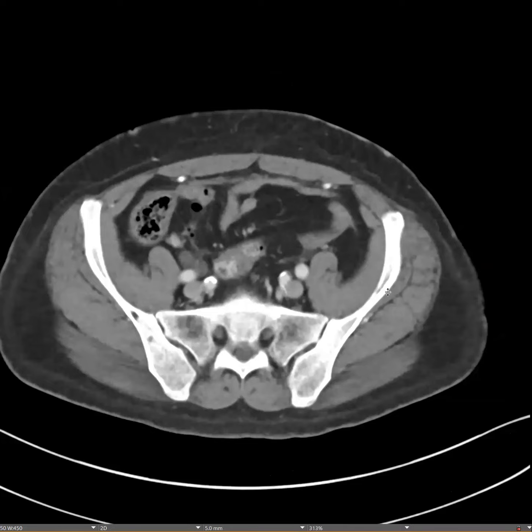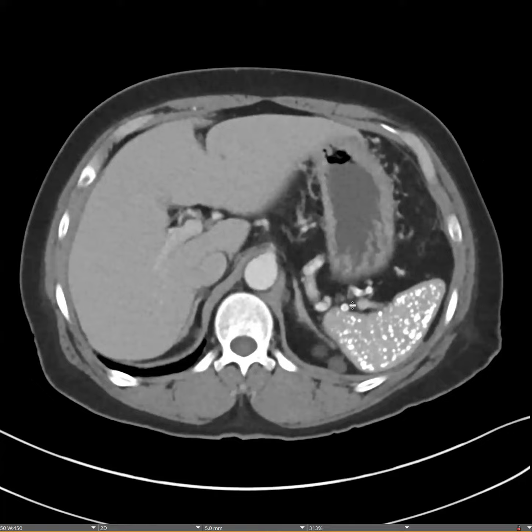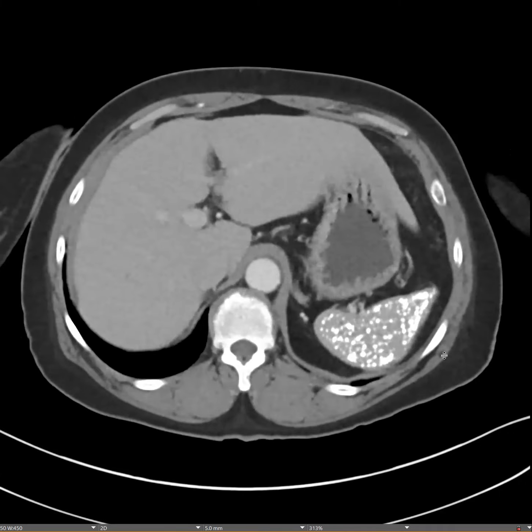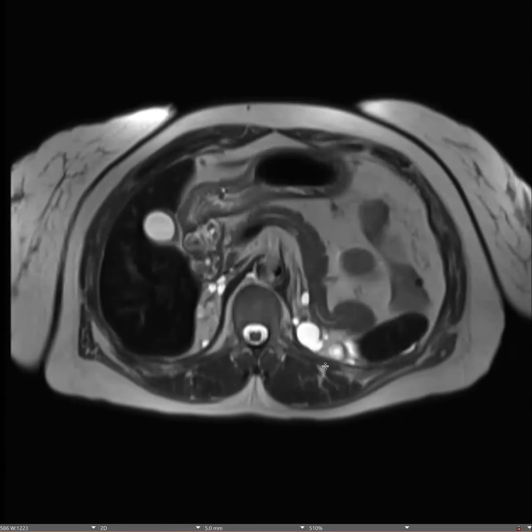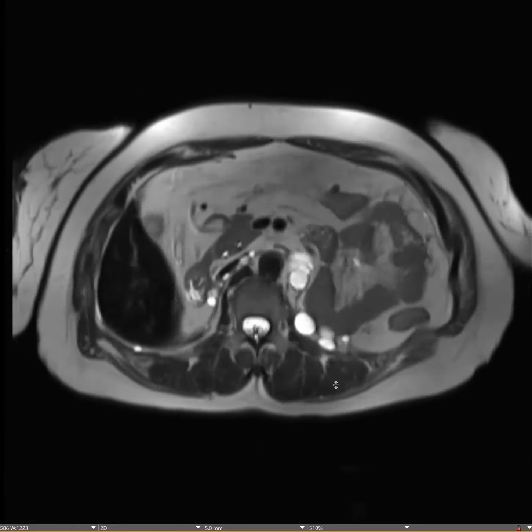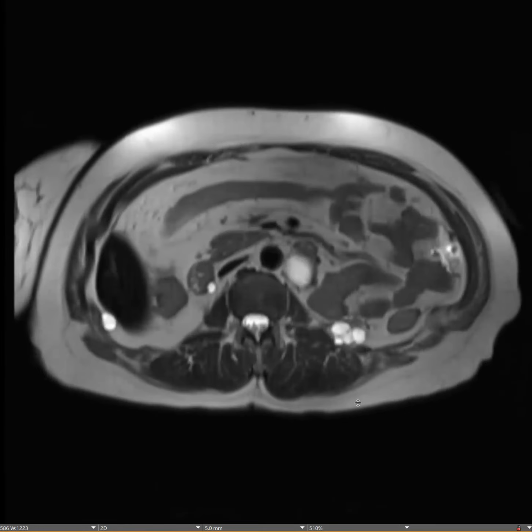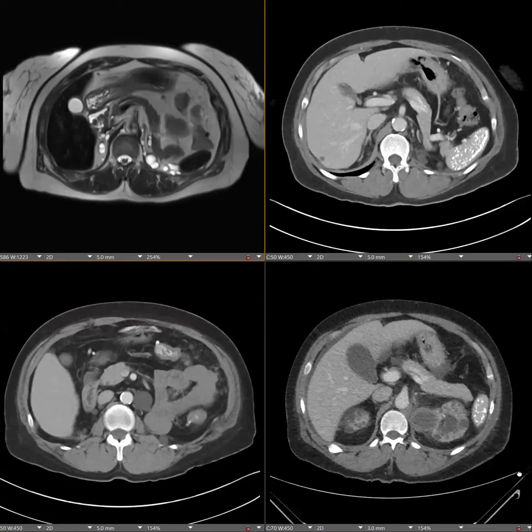They don't look solid enough to be like splenosis. Yeah, because he still has a spleen, intact. So he has multiple of these. So we did an MRI and T2, these are the locations. This is weird. Yeah, I'll show you the post contrast.